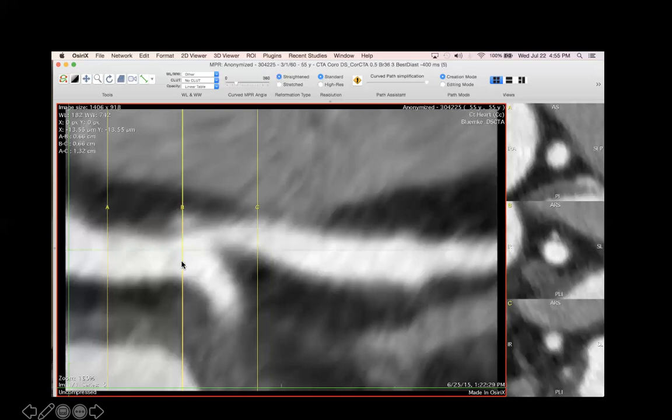The next slice that we'll sample, axial to the vessel, we have the left main, or right at the end of the left main, plus this lesion. And you can see the lesion basically looks like a bump on the coronary artery, and there's a bright signal here. And that bright signal is a little piece of calcium. It'd be quite small in order to make such a dim signal. But the orifice itself, the left main, looks okay.